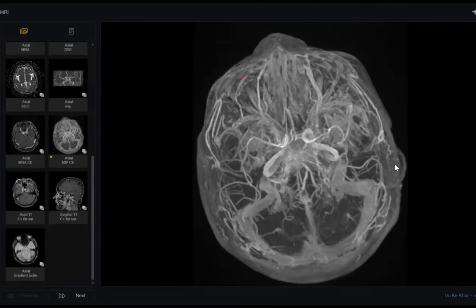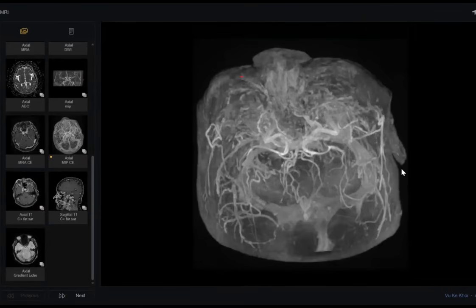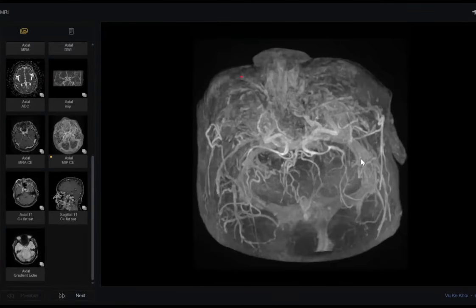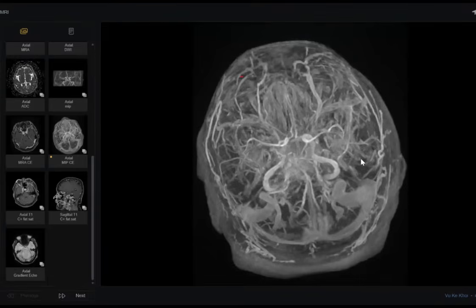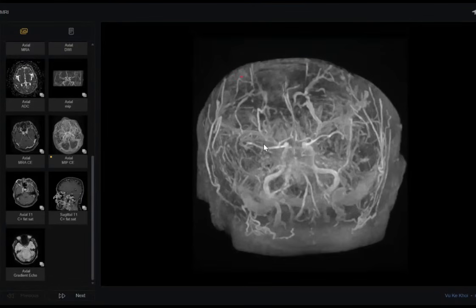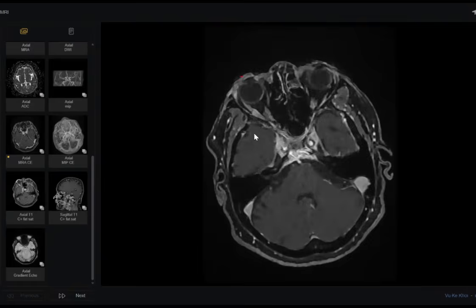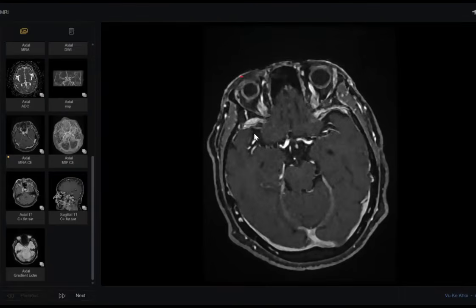What happened? Sir, I'm looking at the image to see if there is any defect. I do not see the... Sir, there are multiple collaterals formed on both sides of the brain. So, click the mouse, one second. I will help you. Okay. What happened here? Look. What happened?